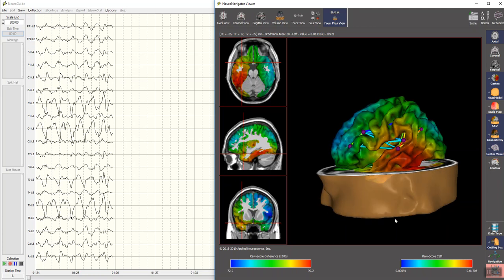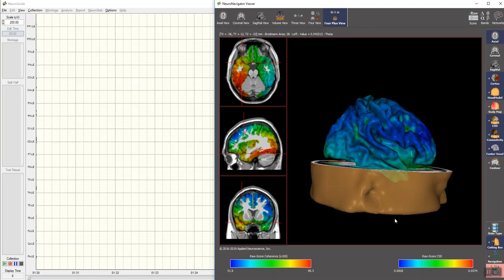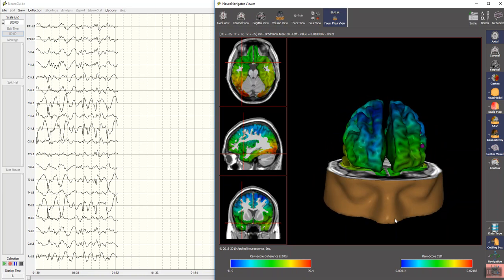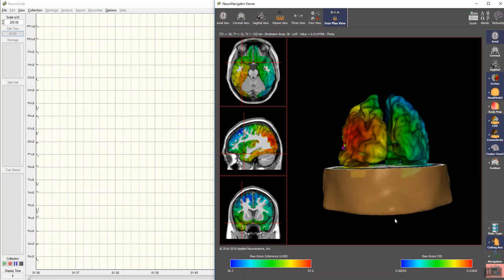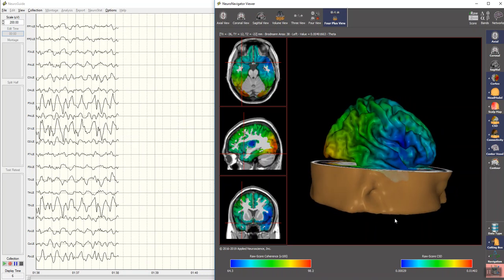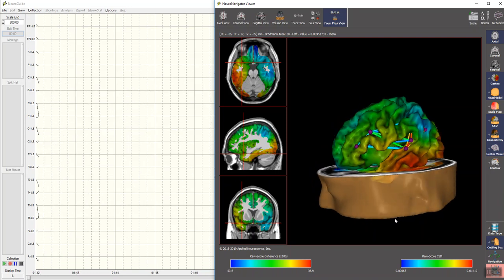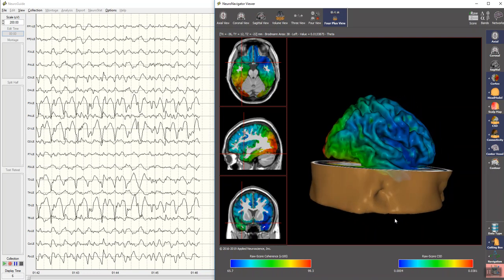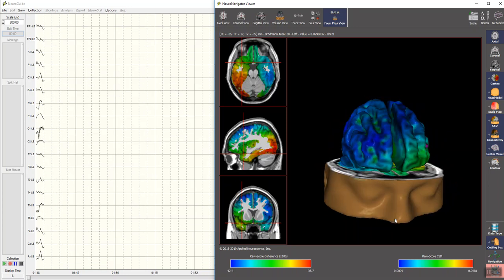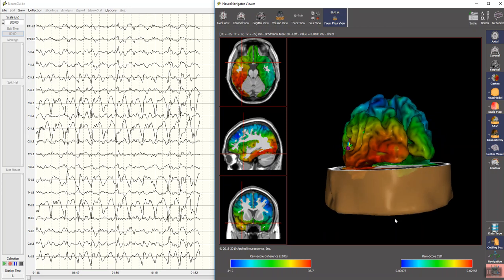On the right is a visualization tool called the NeuroNavigator. This particular tool has a lot of flexibility, and I'll be going through it, and can be used as a standalone, in that you can record EEG and then import it into NeuroGuide and evaluate the patient's EEG in detail, and determine information about the sources of an epileptic focus or a gross pathology.